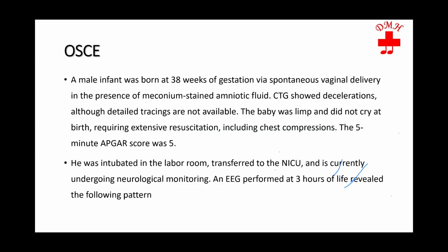Okay. Now, the male infant was born at 38 weeks of gestation by spontaneous delivery. There was meconium-stained amniotic fluid. CTG was abnormal; however, the tracings are not available. The baby was limp, required extensive resuscitation including chest compression. The 5-minute Apgar was 5. Baby was intubated in the labor room, transferred to the NICU, and is currently undergoing neurological monitoring. EEG was done and this is the 3-hour tracing. Okay.